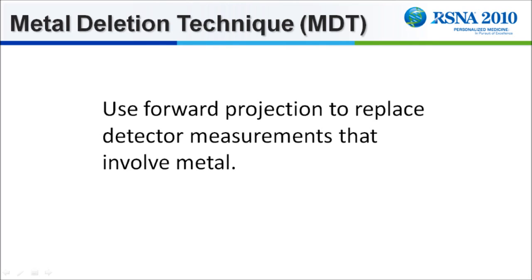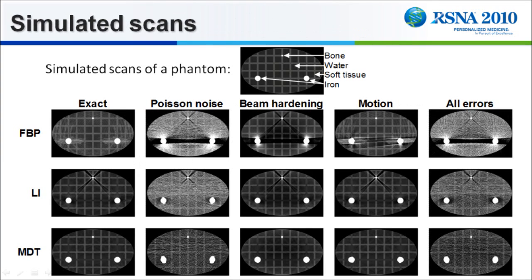We iterate the procedure in order to improve image quality. We apply an edge-preserving blur filter before the forward projection to reduce noise. And before starting the reconstruction, we adaptively expand detector elements in regions with low photon counts in order to reduce Poisson noise.